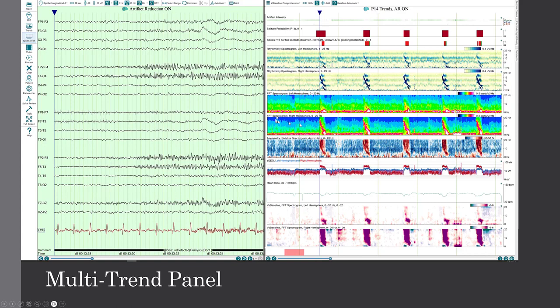We have our FFT spectrograms, again showing what they've referred to as flames. I think they still do in many places, where you've got the seizure pattern lighting it up in that fashion. We see this asymmetry relative spectrogram, where we have this increase in the amplitude on the right going faster or slower, but we get a little bit more information too. We see that during the interictal pattern, we have the left being more prominent than the right during the interictal period. And what is the reason for that? Did the left increase in amplitude?